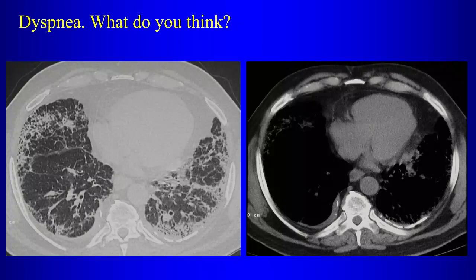Well, what are the findings? No findings? Go ahead. Well, I can't hear you. What are the findings? First of all, is this a fibrotic interstitial disease? Do we have fibrotic interstitial disease here? Yes or no? Yes. And so what are the findings that tell you there's fibrotic disease here?